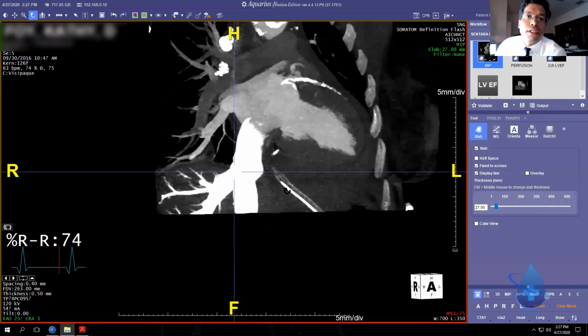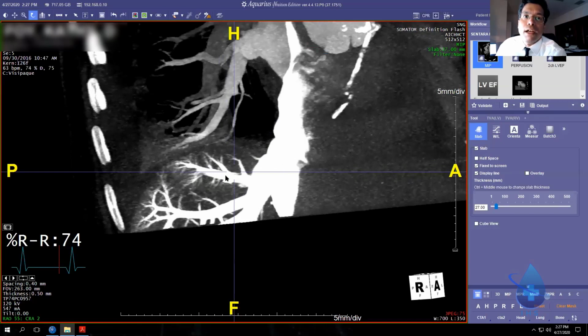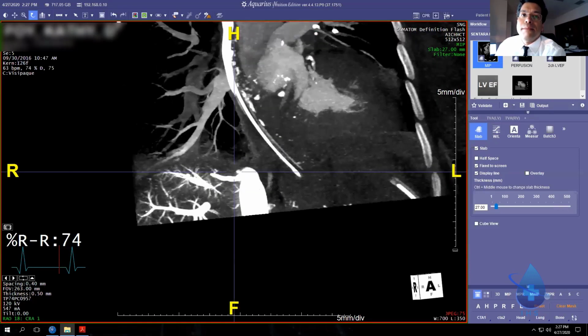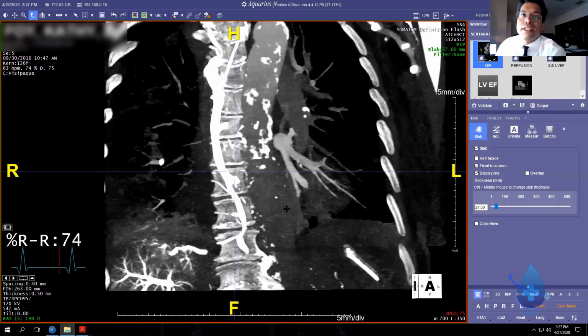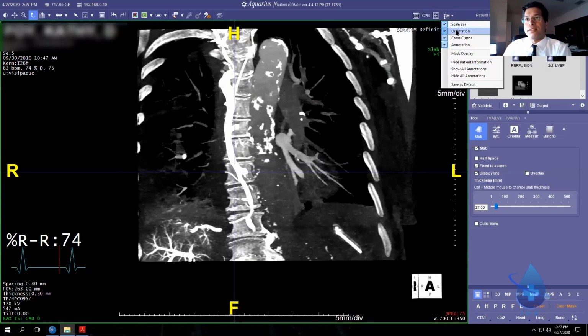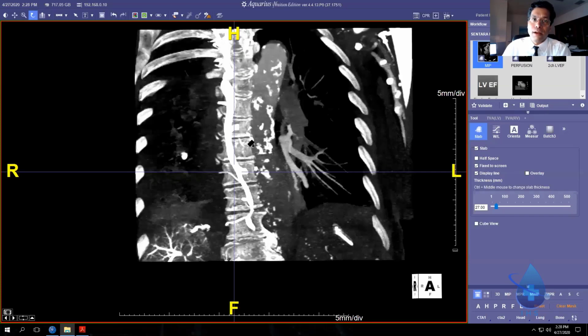And if you look here, you'll see this is the liver, hepatic veins, IVC, all bright with contrast. That's not good. That means there's high right atrial pressure. And then this is the azygos vein she saw. See this azygos vein? It's not dark. It's filled with bright contrast like that. That means there was high pressure that also forced the contrast bolus that we were injecting in the arm. It forced it into the azygos as well.